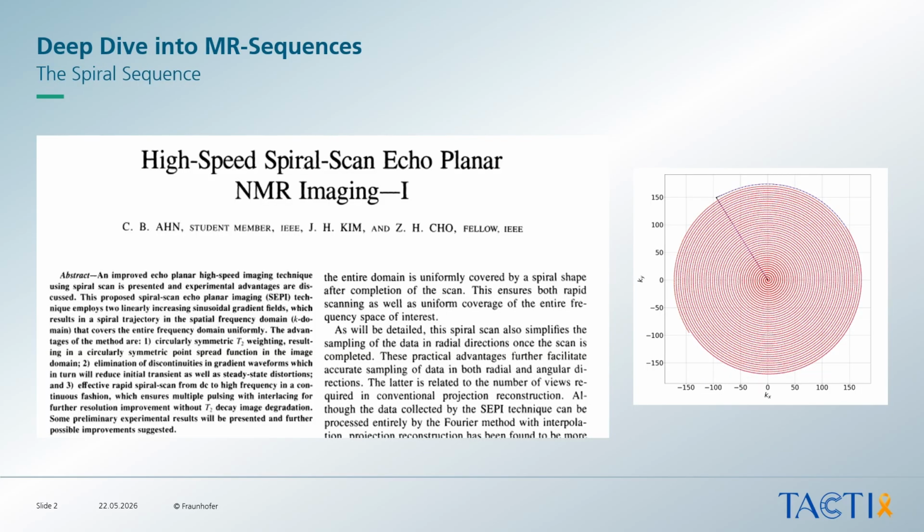So we also quickly want to have a look into another non-Cartesian way of sampling MRI data, which is the spiral sequence. So in contrast to Cartesian sequences or radial sequences, we now acquire k-space data in the form of so-called spirals. So we start in the k-space center and spiral our way into the outer regions of k-space. And we'll quickly look through that in the gammaStar frontend too.